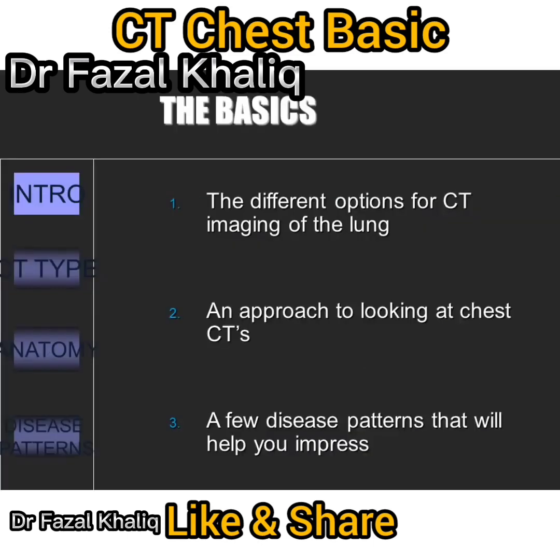This is an interactive tutorial to teach you the basics of approaching a CT of the chest. Once you know this, you'll be ready to shine. This presentation is laid out in 3 sections. First, we will discuss the different types of chest CT. Then, we will go on to discuss how you should systematically approach the chest CT every single time. Last, we will discuss some common disease patterns and their differentials. Let's begin.